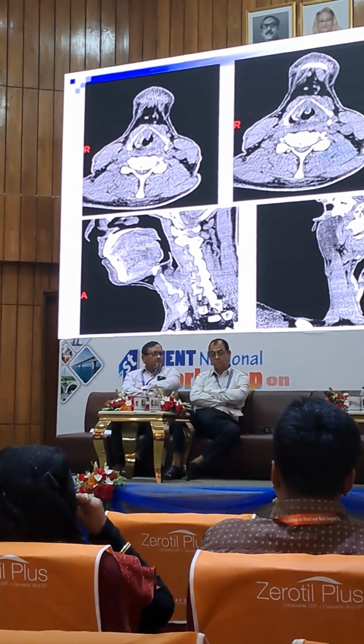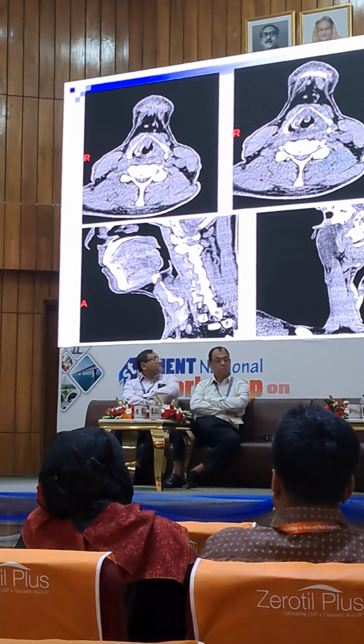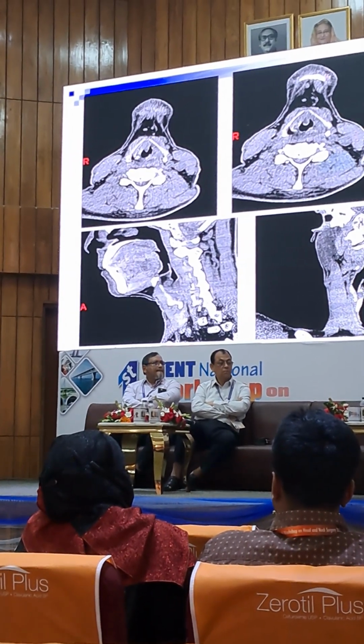And in sagittal we see a large lesion in the supraglottic area. We see on the left side there is a large lesion in the supraglottic area.